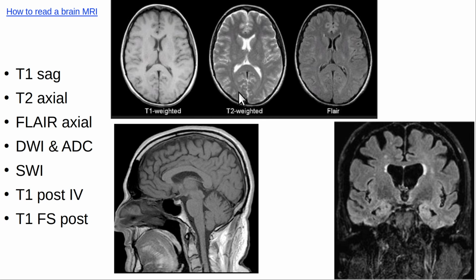All right, well then when we look for pathology, the secret of seeing disease, pathology means disease, on a brain MRI is you want to increase the signal of the pathology and suppress the signal of the background. So the perfect sequence for that in the brain is called FLAIR. And all you need to know about FLAIR is that it's a derivative, a subtype of T2 sequences. And the pathology is going to be bright. Like here's a FLAIR image, and you can see the pathology stuff is hyperintense. It's bright. But the cerebrospinal fluid, the fluid, is dark.